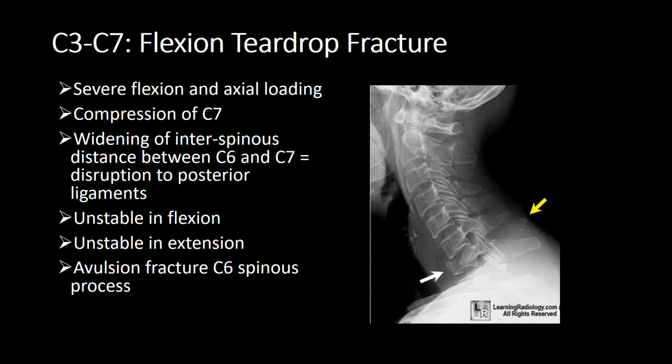Okay, so let's have a close look at this picture. So A is adequate. Okay, we've got the base of the skull on. 1, 2, 3, 4, 5, 6, 7. So in clinical practice, you would need to be able to see the whole of T1. But this is fine in this context.